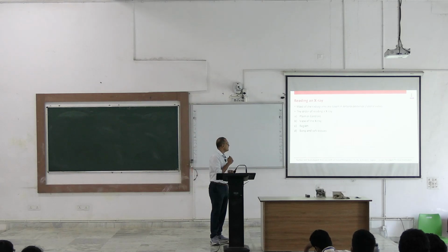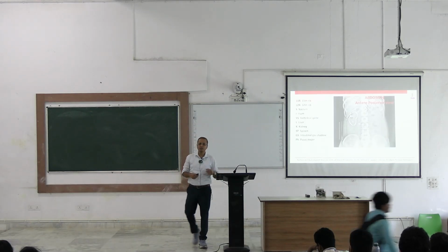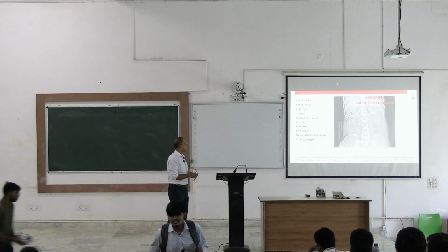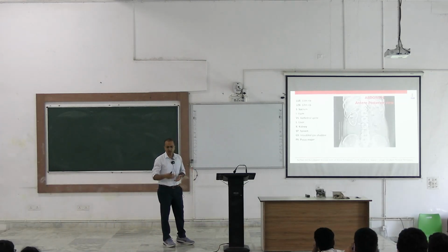So whenever you are reading this, you are going to do a narration of the X-ray plates. This is something we have already done, starting from the views, the types of X-ray, the region and the bony tissues. With this same formula, we have learned the upper extremity, lower extremity, thorax, etc. So this is also relevant for abdomen. Whenever you are given a picture like this with a plate, we have to do the same series of decoding of this X-ray.